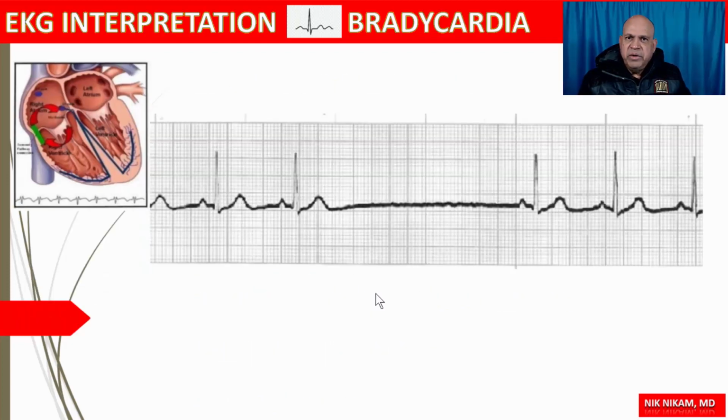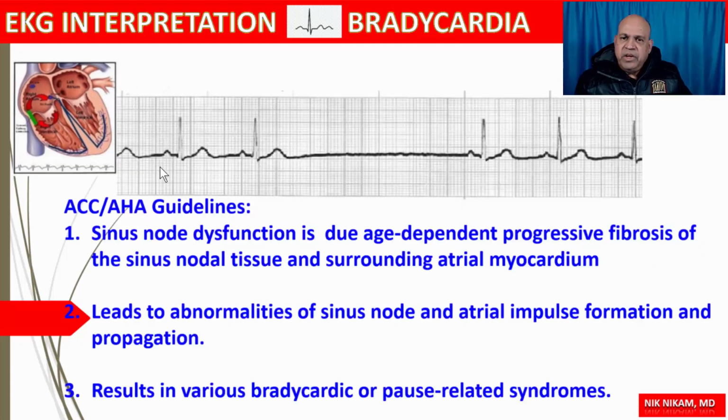Take a moment and write down your diagnosis, and more importantly, write down all the findings you see in this electrocardiogram, and when you're ready, let us continue. What we see here is a sinus rhythm with a sinus beat, another sinus beat, and there's a long pause followed by a sinus beat, and another sinus beat. So this is an example of a long sinus pause.